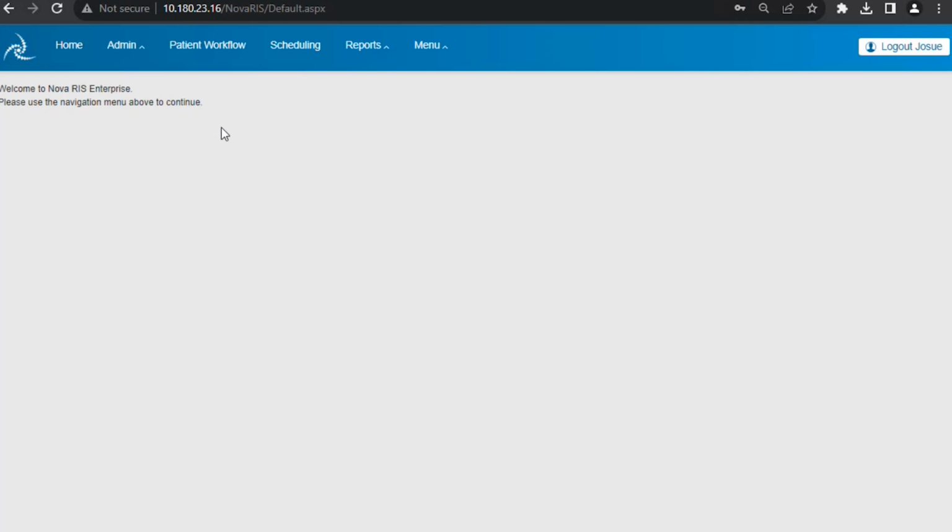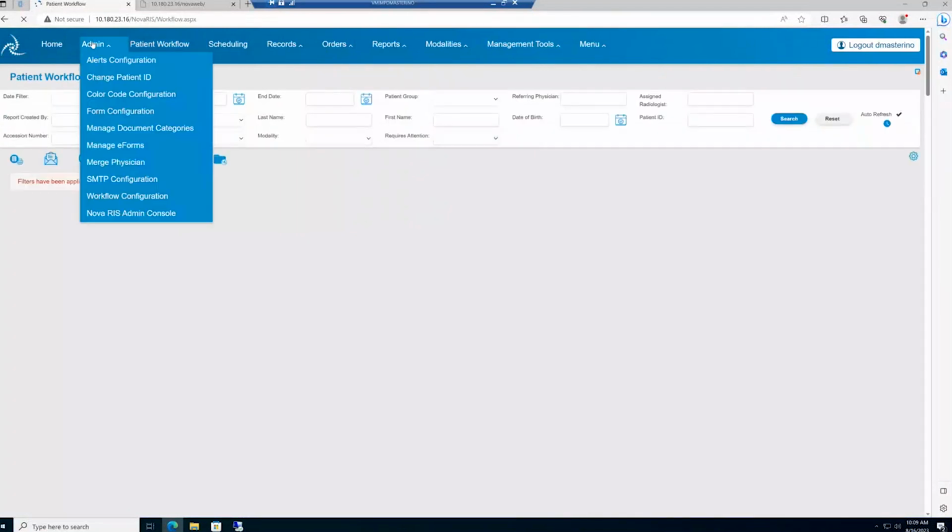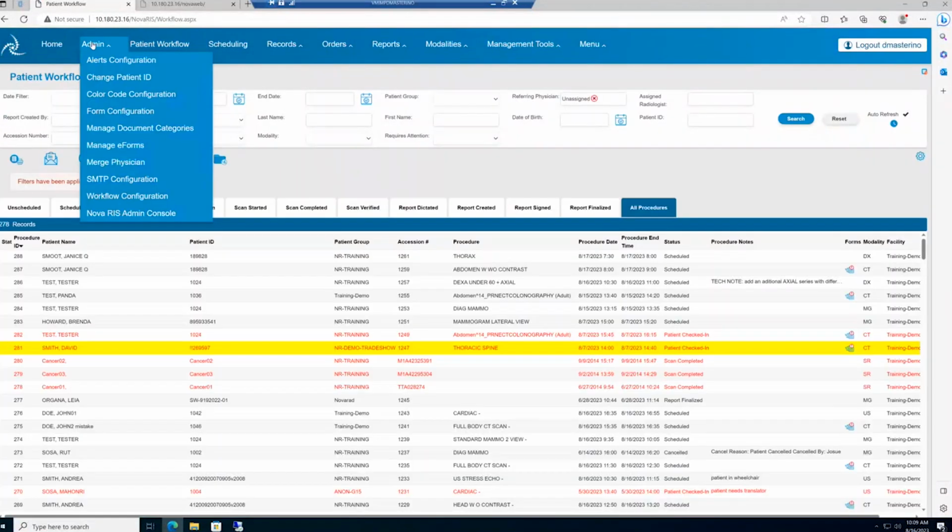Now I'm going to give time to Dina, so she will start showing you some of the admin features. We're going to begin with going over a handful of the admin features that are available to you. One of the reasons I think that's important is, whether you're a new user, these are all admin roles that you would have access to.